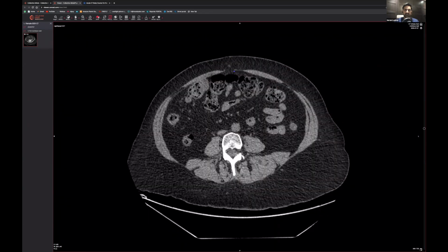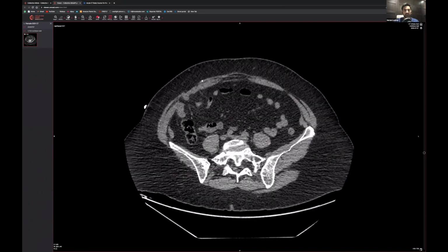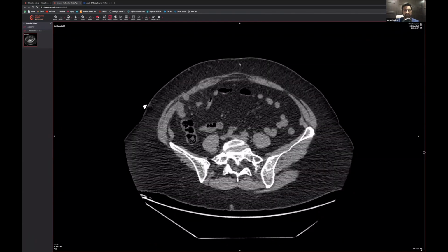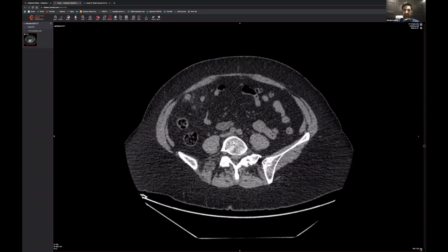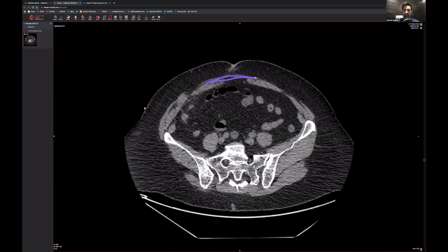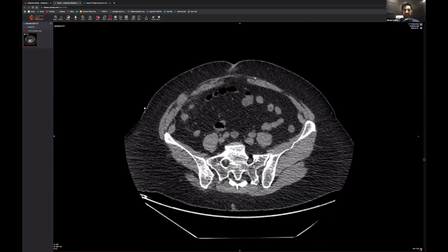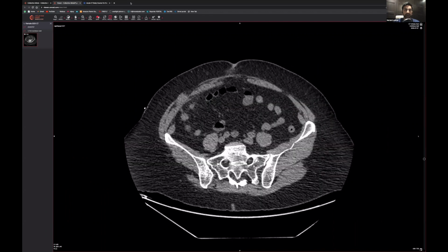And the thing is, they've got these hernias here and that hernia down there, probably because they've had previous surgery. It's probably going to be keyhole surgery of some sort. And probably because of this hernia, look, they've had a previous hernia in the past. You can see all these clips from the anterior body, and that's actually probably a mesh. Can you see that? So you've got divarication of the rectus muscles, with this kind of sheet going along like so, and these surgical clips over there. So they've had previous surgery, but this is actually, I think, going to be an appendicitis rather than anything else.